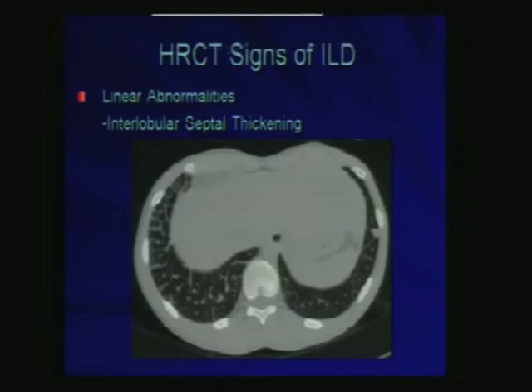I'm just going to stop here, but basically, this is a good example of interstitial lung disease. Again, these reticular lines outlining the secondary pulmonary lobule. I was going to go to the different causes of interstitial lung disease, trying to contrast them between fibrosis versus tumor and so on. But as long as you'll be able to recognize it, I think this is very important. And this is how we contrast it also with the airspace disease.